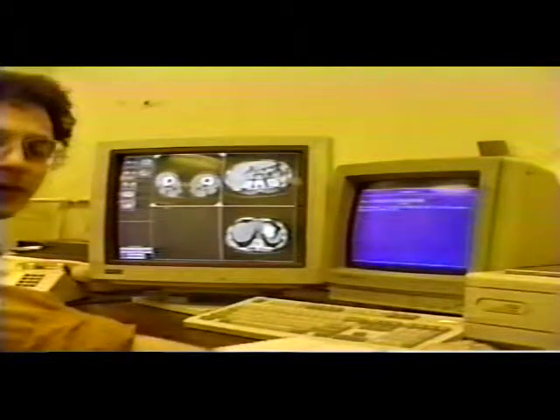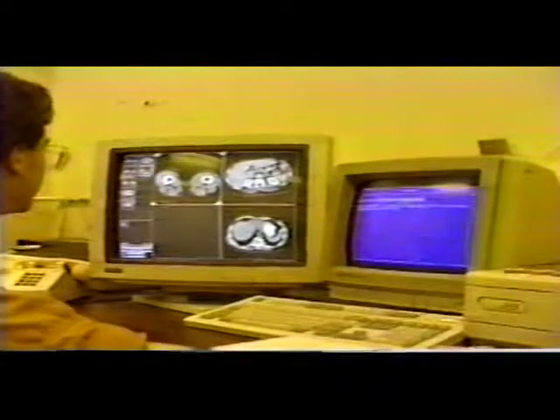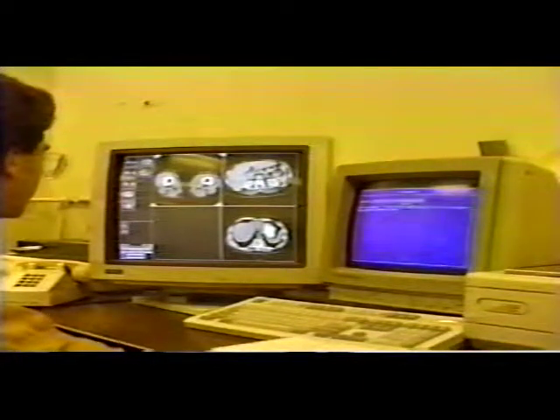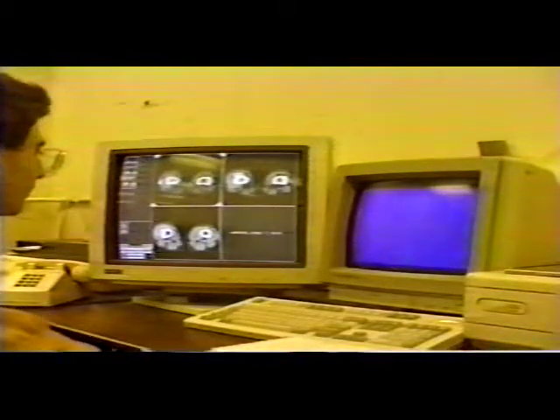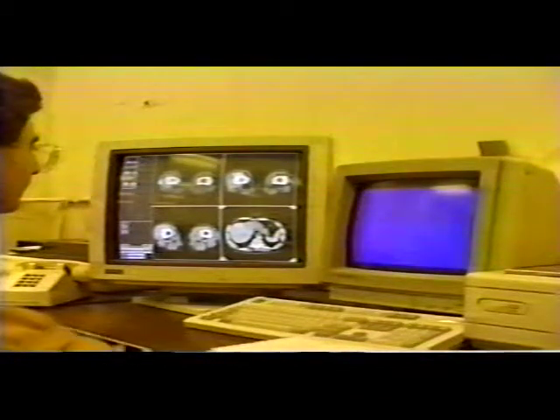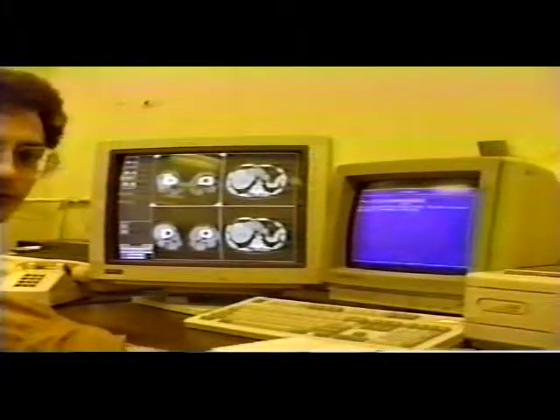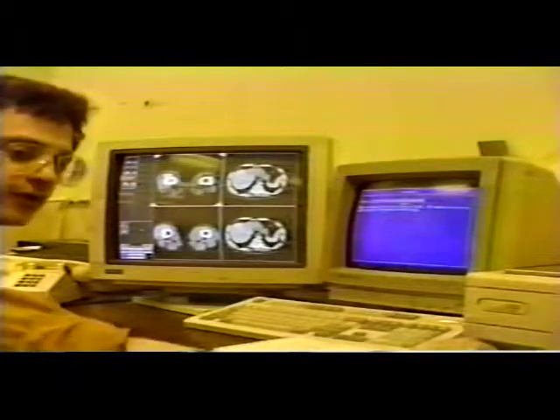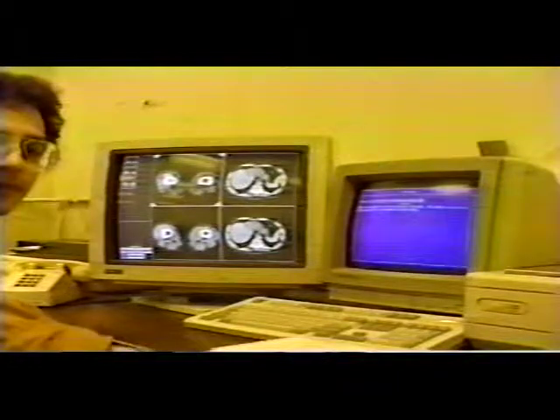Now if I'm interested in one of these images, and I want to compare it with an image in another study, I can put it into this holding area, and then I can pop to the previous directory, click on the baseline study, and I can compare. You'll notice that these icons down here behave in the same way as these icons here. The upper left area is for images in this study, and the lower left area is for images that have been held. If I'm done with them, I can click on that and clear.